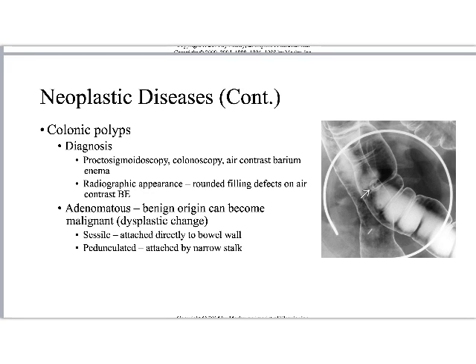Colonic polyps. These are little tumor friends that we pretty much all develop over the course of our lives, right? We can use a bunch of different weird scopes to look at these things, or we can use an air contrast barium enema. We're going to see these rounded filling defects on air contrast BE. So in this case, we've got a little tiny polyp here. They've applied the paddle to it to separate out pieces of the bowel, and you can see that little rounded thing looks like a little mushroom inside the bowel, right?